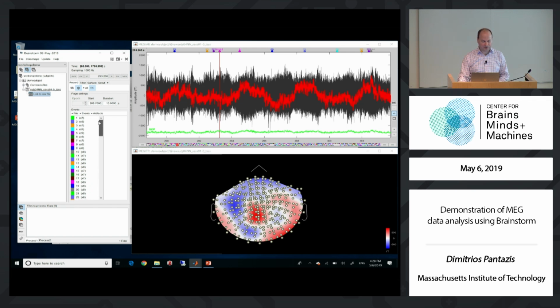Now, I have all these different codes up to 92 because we use 92 stimuli, but I don't really want to use all of them.